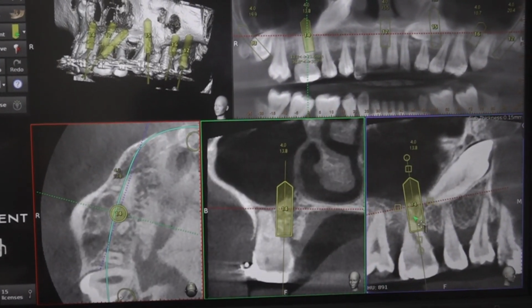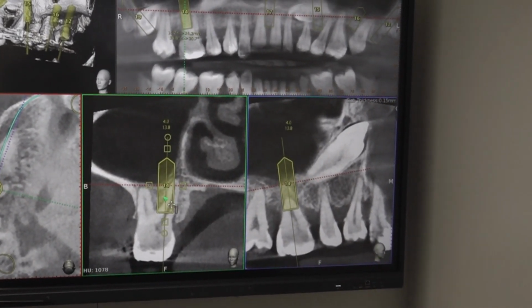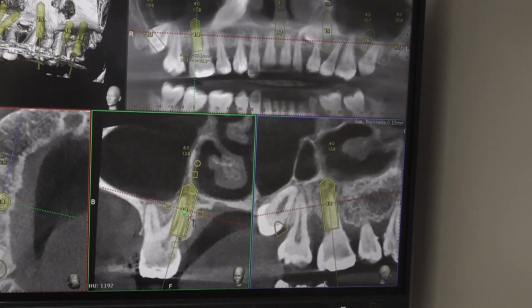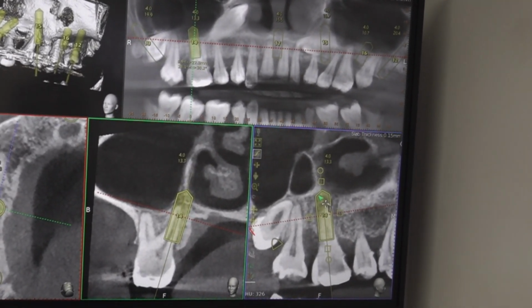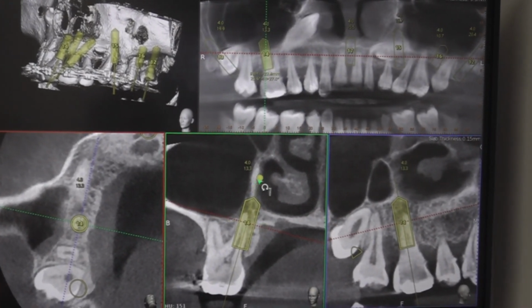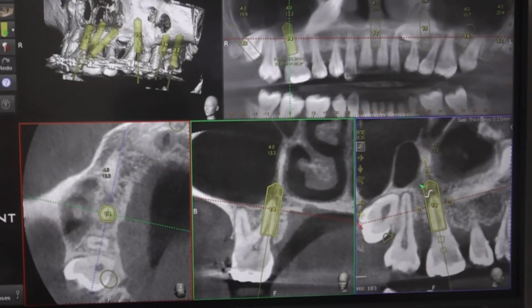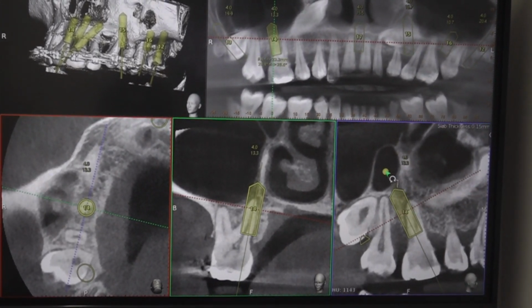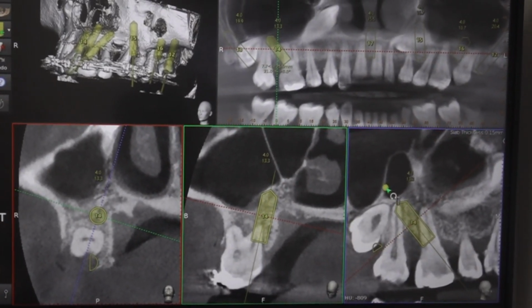So beyond second premolar, there is no bone. Maybe in palatal root, right? There is some good bone in the 6. 5.5, yes, 5.5 also we can place. That means we have to go for a simple basal design. Or if we tilt it slightly distally, we are in some good bone, fortunately.